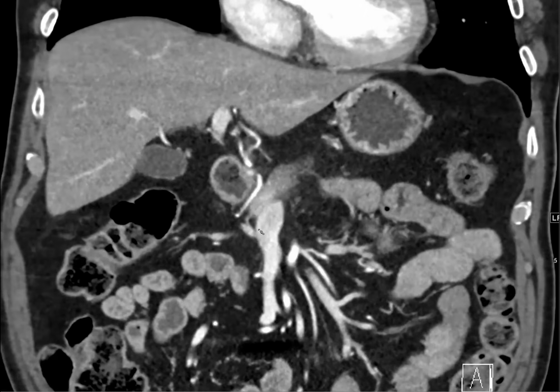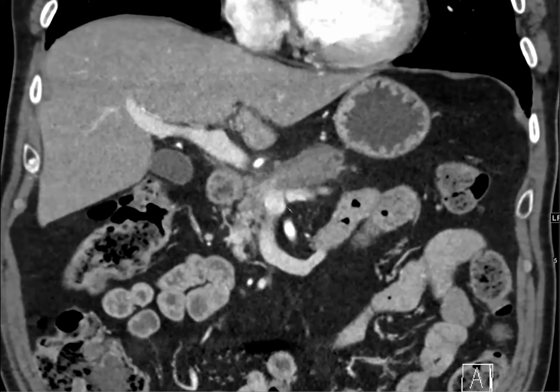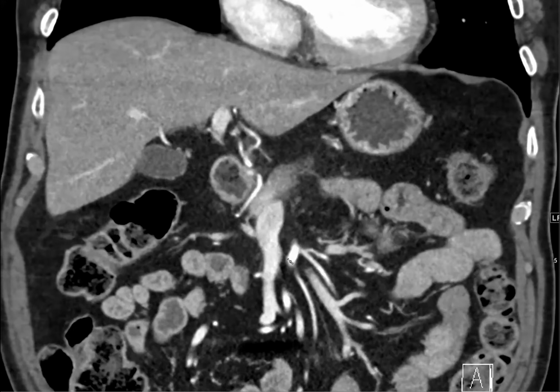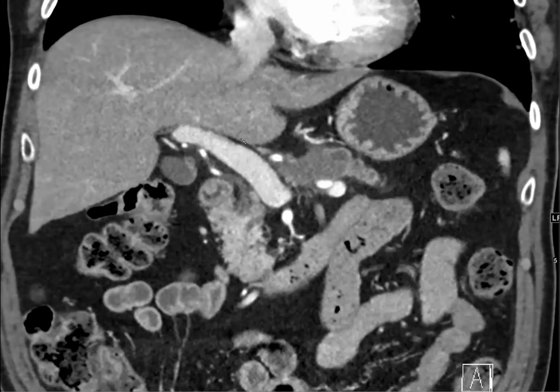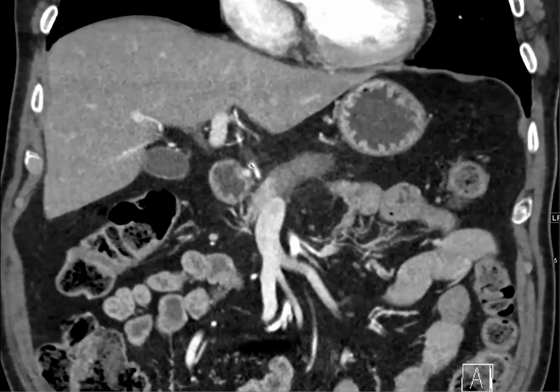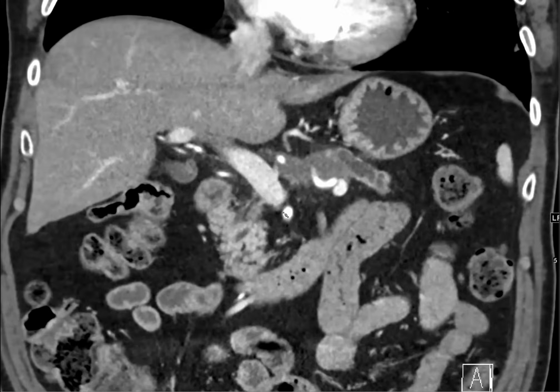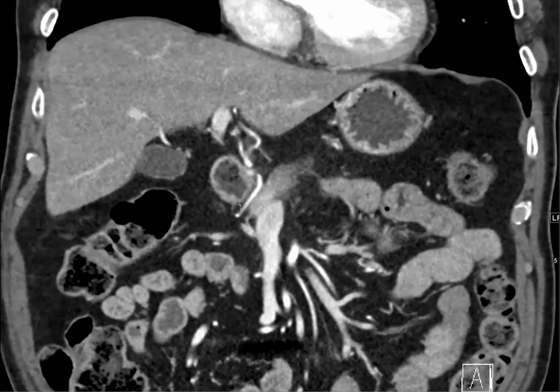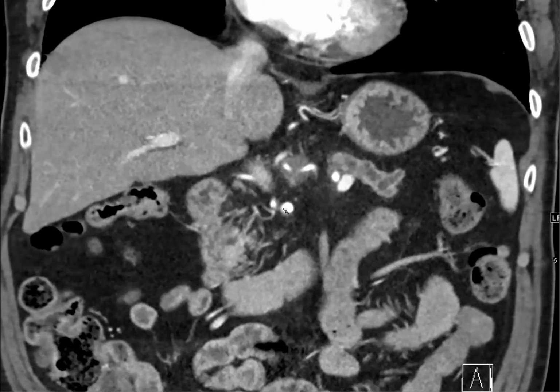But if you have an intact GDA, the SMA can actually feed the GDA retrograde through the pancreaticoduodenal arteries, and it'll fill the GDA retrograde, and then that'll fill the hepatic artery. In this case, that retrograde flow is going to feed the left hepatic artery, and then the right hepatic artery is spared because it's arising from the SMA and it's separate from the tumor. So especially if you have this replaced right hepatic artery, you can do this Appleby procedure and resect the proximal aspect of the hepatic artery.